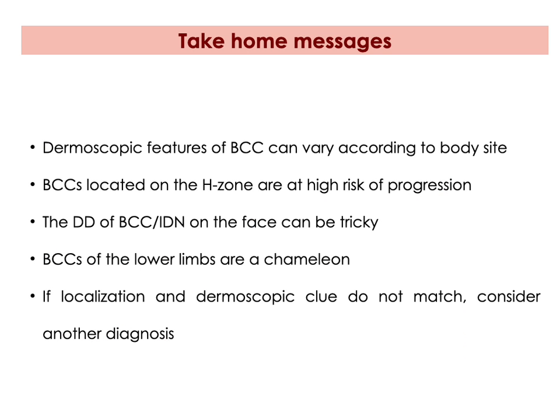So the take-home messages are that the dermoscopic features of basal cell carcinoma can vary according to body site. Obviously, BCCs located on the H zone are at high risk of progression. The differential diagnosis of BCC and intradermal nevus on the face can be tricky. The basal cell carcinoma of the lower limbs is a chameleon, and we saw that shiny white structures are the most frequent criterion that we can see here. And if localization and dermoscopic clue do not match, we should consider also another diagnosis.